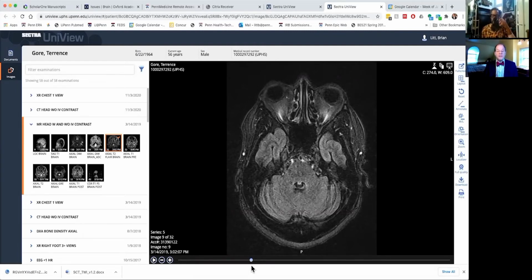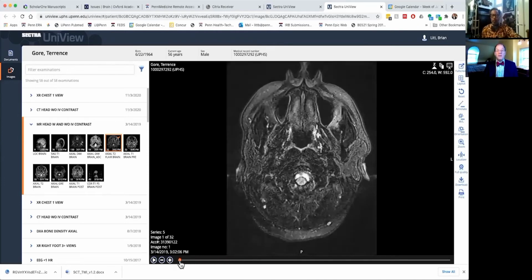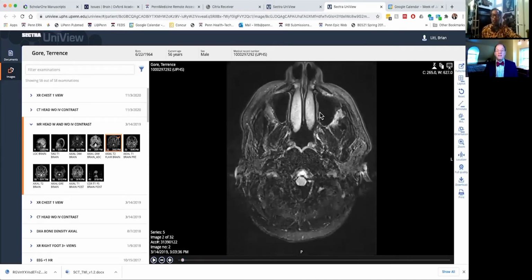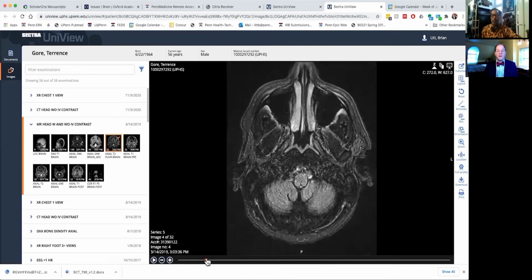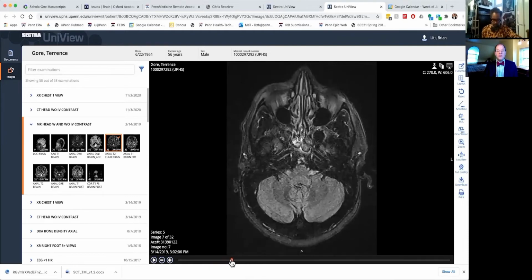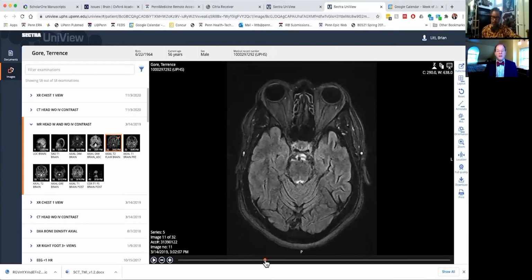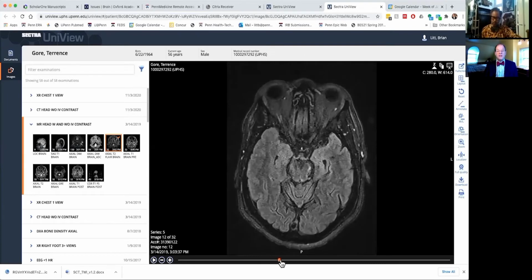So we're going to climb up, and just to give you an idea, it starts way at the bottom here. The sinuses. This is the brainstem. We're going to move up slowly. So we're moving, looking at slices of you. Cerebellum here. Moving up, now we're seeing the temporal lobes and the top of the cerebellum. This is the midbrain, the pons. But let's get into the business.